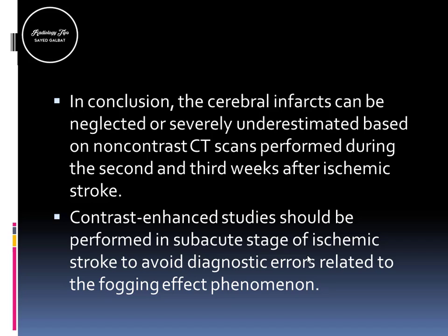In conclusion, due to this fogging effect, the cerebral infarction can be neglected or severely underestimated based on a non-contrast scan performed during the second and third weeks after ischemic stroke, which is the subacute stage. A contrast-enhanced study should be performed in the subacute stage of ischemic stroke to avoid diagnostic errors related to the fogging effect phenomenon.